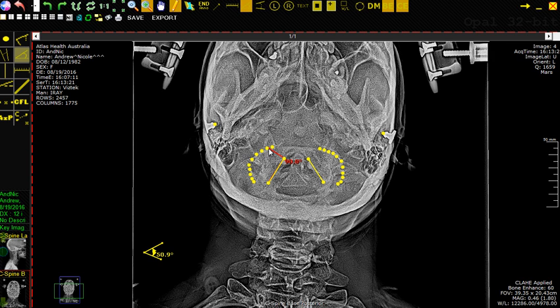90.8, so that's a little too much, and that's just with the slightest bit of movement. So this is about as close as I think I'm going to be able to get at 90.1, so I click it right there, and then it makes this, so I can put my annotation either on the inside or on the outside. I'm just going to put it on the outside because it keeps it a little bit cleaner.